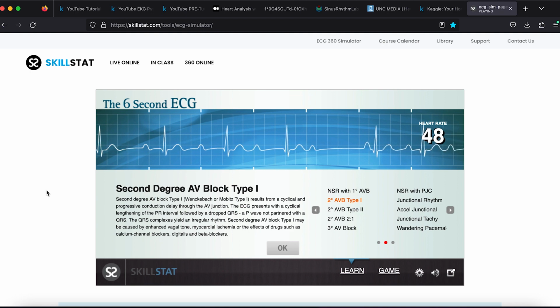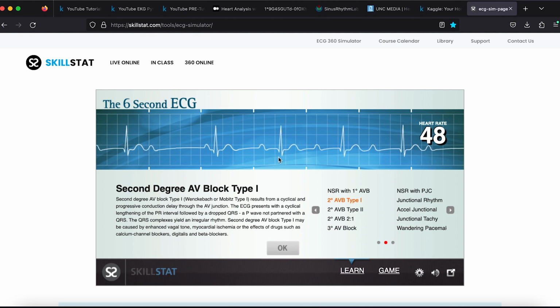For example, here's a type of arrhythmia where the P wave is actually not able to kick off the rest of the heartbeat. If you see the big QRS complexes, you see the R wave spike, but then you'll see these lonely P waves that either take a while to kick off the heartbeat, or are just lonely. Like you see this one, the T wave happens at the end of the QRS complex on the far left of this EKG, and then right after it a P wave happens, but then no heartbeat happens after that. And then it takes a whole other cycle before the P wave is able to successfully kick off the rest of the heartbeat.